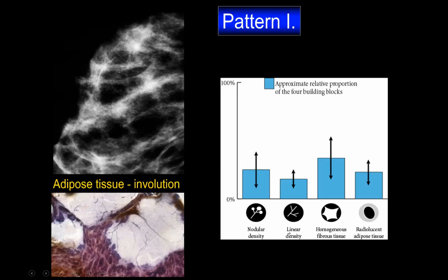The next feature of pattern 1 is the presence of adipose tissue. And so the English medical term fibroglandular tissue is brilliant. A good radiologist doesn't look at the white, the radiopaque. You look at the black in order to see the white. If your callback rate is too high, then I believe that you are still looking at the white.